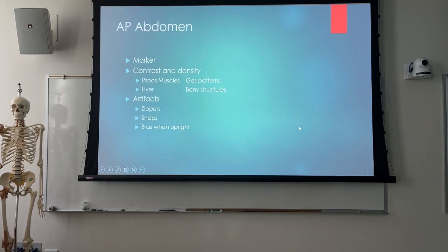So we're going to take a look at some other ones that y'all submitted here in a bit as they become appropriate. I think the rest were abdomen. So with abdomen, mark placement, just out of the anatomy of interest. Some people like to put it in the hip. I like to put it in the hip as opposed to, some people will put it on the upper portion. I'll get it in the diaphragm that way, maybe.